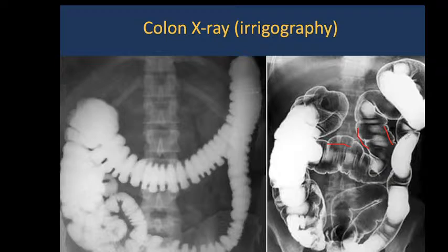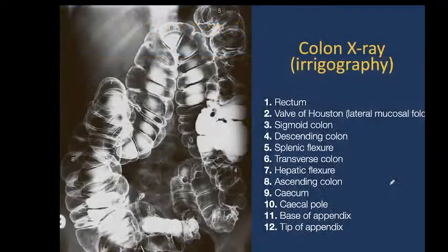Some parts contain barium sulfate. This is also an X-ray after enema, when barium is evacuated. I hope you guess the way how it is evacuated from the colon, from the large intestine.